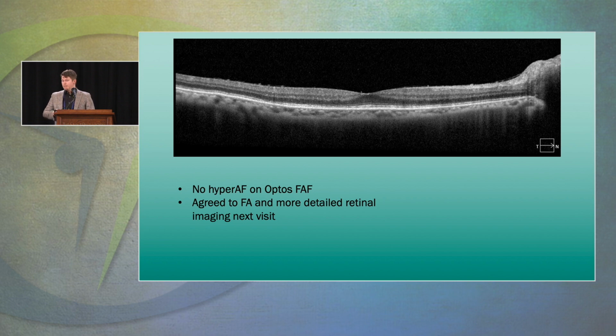We did an autofluorescence, and I didn't include it because it doesn't really show anything different. It's normal. And this patient actually agreed to do a fluorescein with me at his next visit, but I never saw him again, unfortunately.